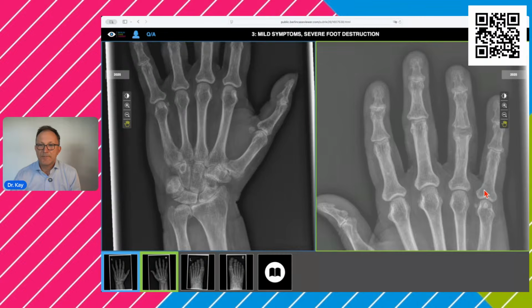So this is an arthroplasty of the PIP joint. We see there is this shape over here, and a similar shape here, and then the joint space looks wider than it should. So there's no normal joint space here. That's a silicone foreign body that was placed into the joint, and that's called a Swanson endoprosthesis or Swanson arthroplasty.